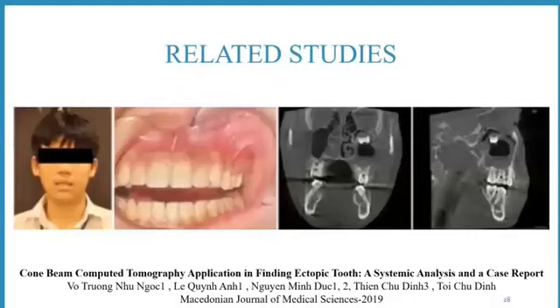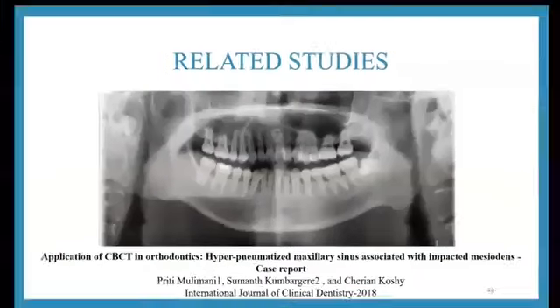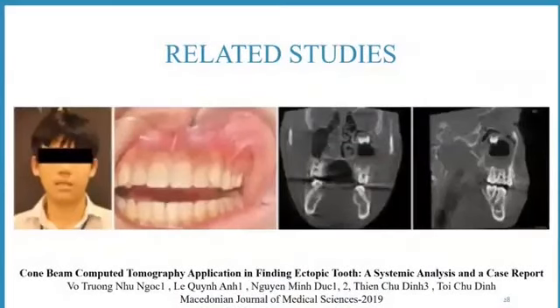The patient was indicated for CBCT for orthodontic purposes and also for maxillary inspection. The CBCT image revealed an ectopic maxillary third molar near the roof of the left maxillary sinus with a surrounding cystic lesion. The mucosa of the sinus was thickened, which suggested chronic sinusitis on the CBCT image.